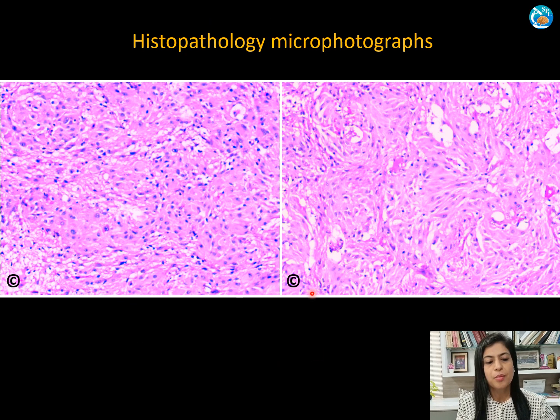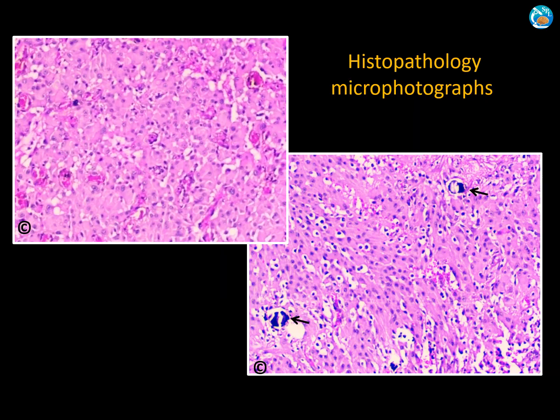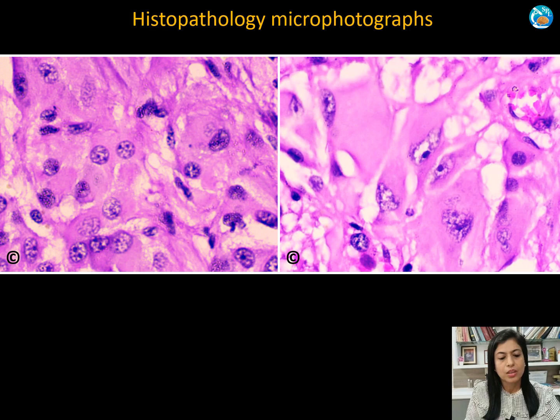Histology: the tumor is composed of neoplastic cells arranged in sheets, nests, and fascicles, and the tumor shows a combination of large plump cells along with small fusiform cells. The tumor has vascular stroma. You can see prominent blood vessels and also foci of calcification in these two areas.